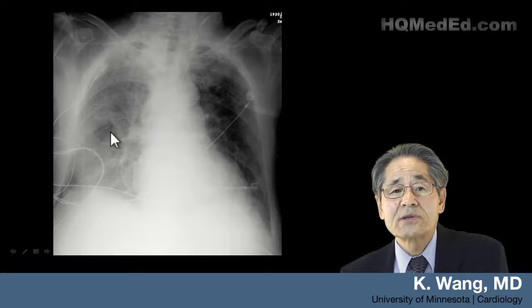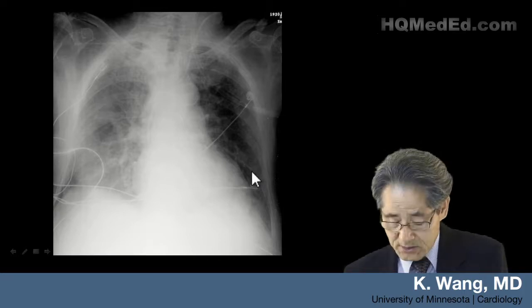This is not as severe as the other one, but again, unilateral haziness or increased density, but lung markings go beyond. So this patient has a unilateral pleural effusion on the right side now, and X-ray taken in supine position will manifest like this.